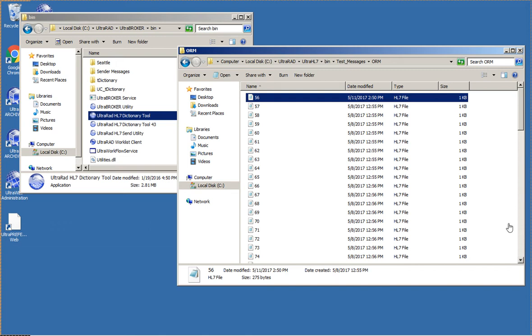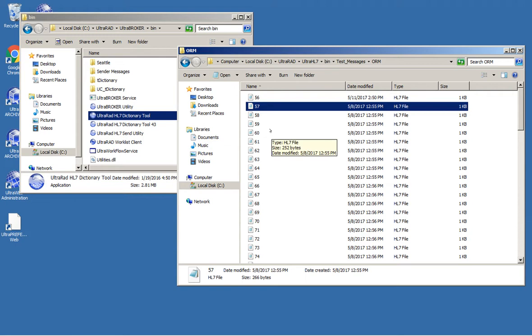In this video, I want to demonstrate how to map HL7 messages into the various UltraRAD products, whether it's an Ultra Gateway, UltraBROKER, or Ultra Prefetch. All of our products use the same HL7 processing utilities. In this case, I'm going to show you how to map these messages into the UltraBROKER database, which is used by most of our products.